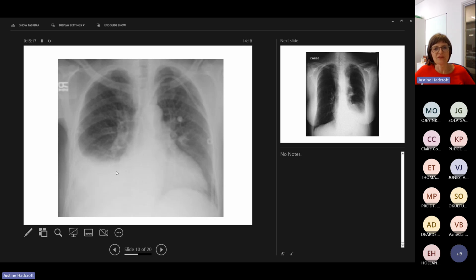What's there that somebody medical has inserted into this patient? Can you see anything abnormal apart from that effusion? There's a catheter, right, going on the right heart? Absolutely, yeah. So there's this line here that's kind of going from who knows where, and I think this is probably a subclavian line.